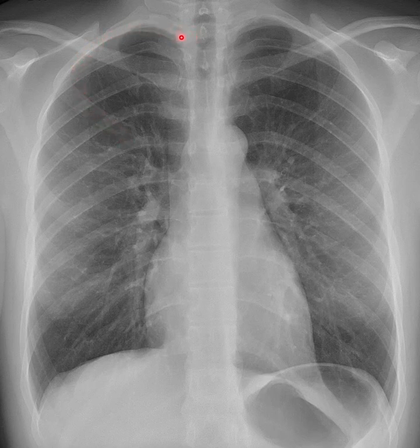So the part of the rib that attaches to the vertebral, the spine, is the posterior rib. The posterior ribs are more horizontal. And then as we get to the angle of the rib here, where it curves around anteriorly, you'll see that the rib starts to point inferiorly, almost like an arrow pointing downward, right? And that is the anterior rib. So we count the posterior ribs because those anterior ribs kind of start to get lost along the way, you know, on some patients' x-rays. It's just easier to find those posterior ribs.